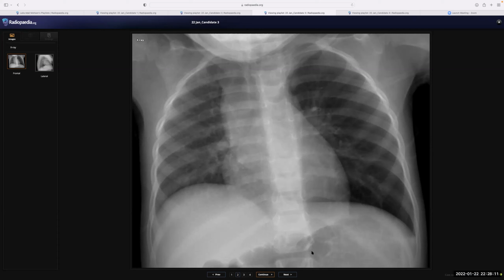And I will convey my findings to the referring clinician in order to discuss in the chest MDT, because this is due to chronic bronchiolitis. This is a sequela of chronic bronchiolitis.